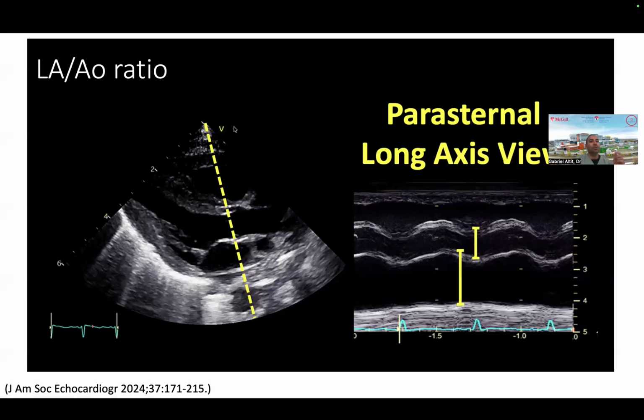So if you have a ratio that is increasing, always think that it might not just be the LA. Be careful because the LA on aorta ratio can be high in any newborn who had a PDA for a certain period of time. So if you're seeing a 29-weeker and now the PDA is closed, the LA on aorta ratio may still be above 1.5. That's because the LA has been receiving more QP:QS for a bit, and it's just going to take time. We often see it in those older babies. It can take like 2 months.